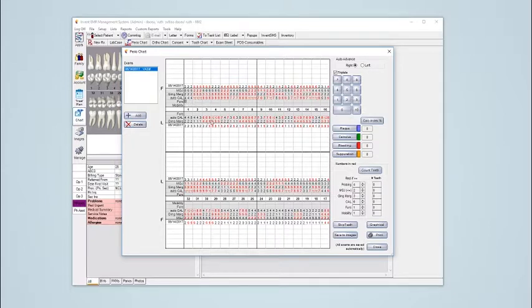I'm gonna go and add the furcation, again keeping the triplet, which will help me enter the readings in a faster manner. This is very handy and rapid. There we go. Okay, so we added all the furcation. Now I will add the mobility. The system will only obviously give you the chance to only enter one number for the mobility at a time for each tooth. Okay, we're done. Now, do we need to hide any of the teeth?